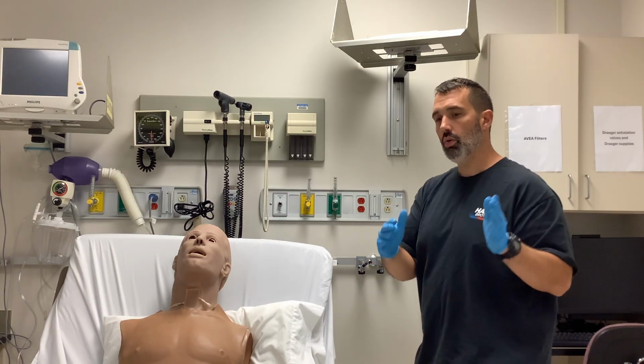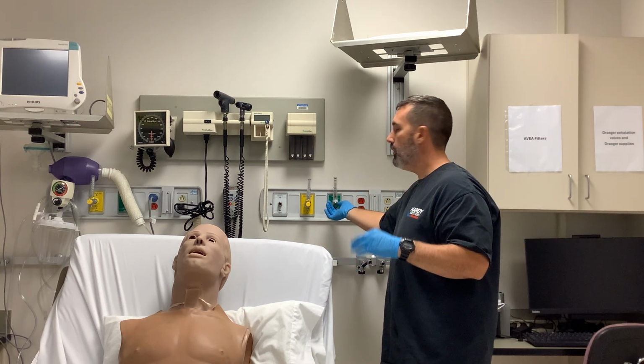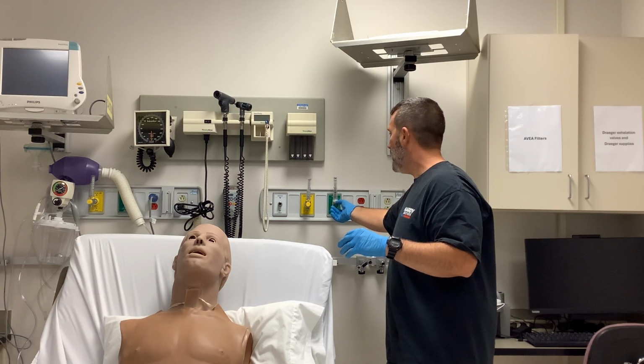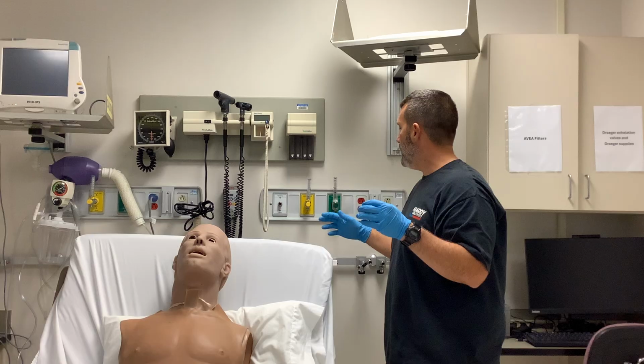If I were to go 40%, still a 3-to-1 ratio, and I now turn this up to 3 liters per minute. So if we're catching on with the mathematics, it's a 3-to-1 ratio.